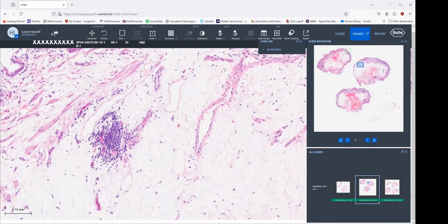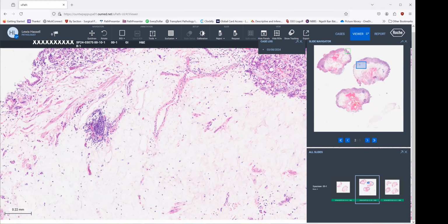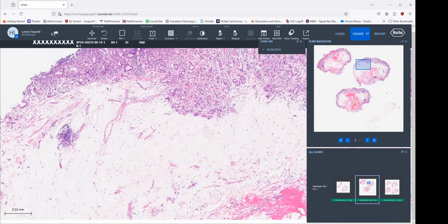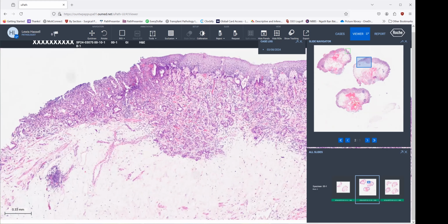So we have a few strands up here of smooth muscle that are part of the muscularis mucosa, and sometimes people will think that that's the muscularis mucosa, and so if we just have a superficial biopsy and we see this tumor here extending below this smooth muscle, we might think that this has become a more serious tumor, maybe what we would call a T1B stage, and therefore potential for metastasis to lymph nodes.